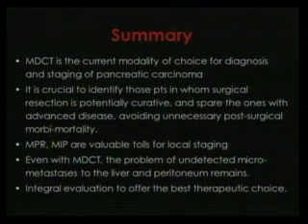In summary, MDCT is still the current modality of choice for diagnosing and staging pancreatic carcinoma. It is crucial to identify those patients in whom surgical resection is potentially curative and spare the ones with advanced disease, avoiding unnecessary potential post-surgical morbidity and mortality. MPR and MIP are both very valuable tools for local staging.